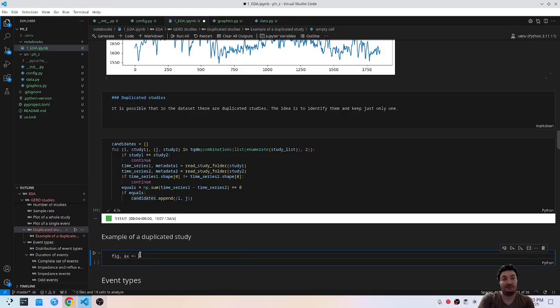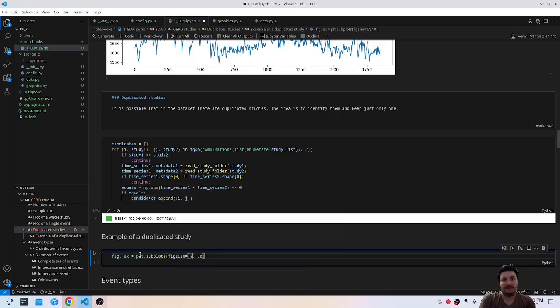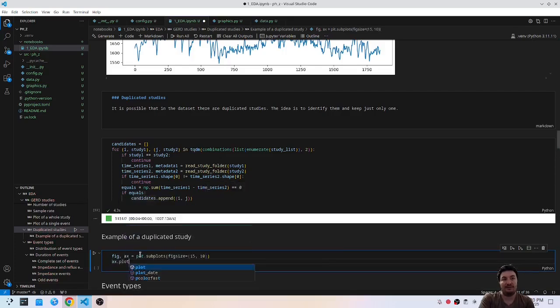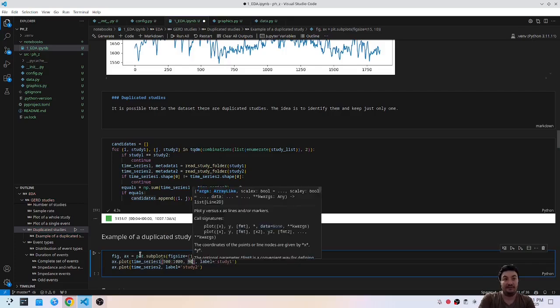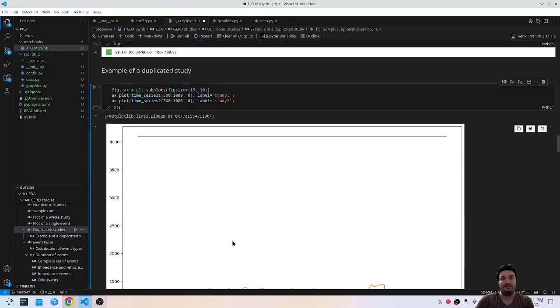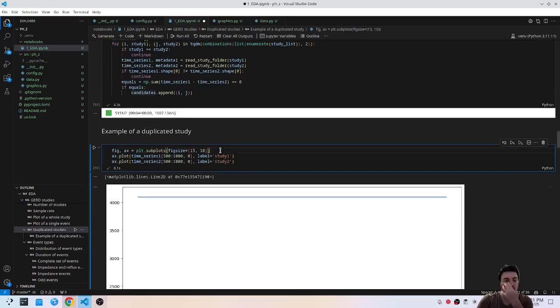Let's plot just for completeness. Fixed size, something like this. Maybe it's too big. Time series 1, time series 2. Same things in Spanish. I'm tired. Let's just put something in there. Okay, this is not equal. Okay, now.